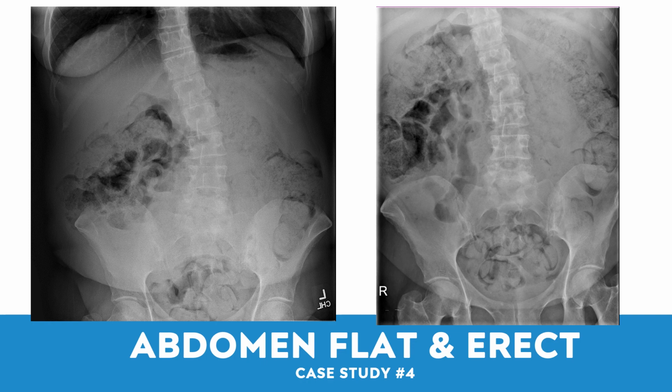People, when they abuse narcotics, usually have a lot of constipation issues, and this clearly shows that all this mottled looking stuff in here is fecal material that seems to be impacted all the way through their abdomen on the flat and erect. Very painful. But narcotic users usually have a lot of this.